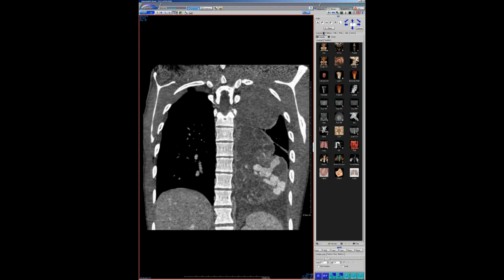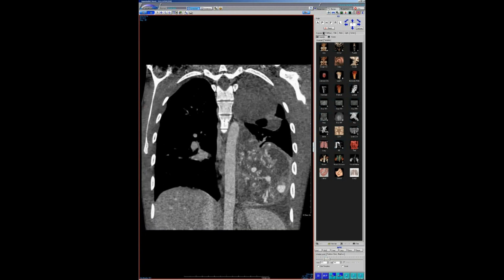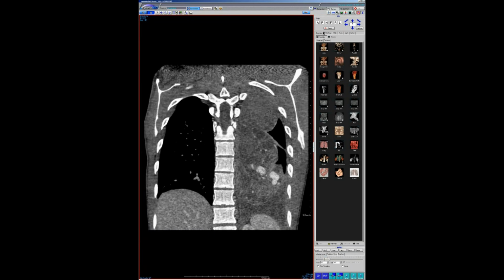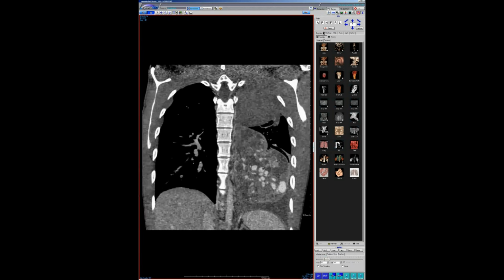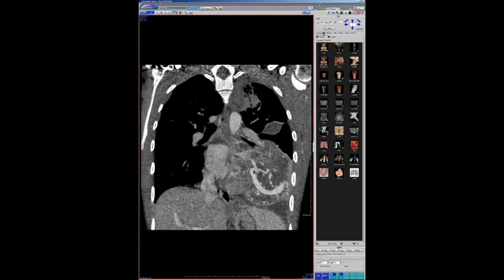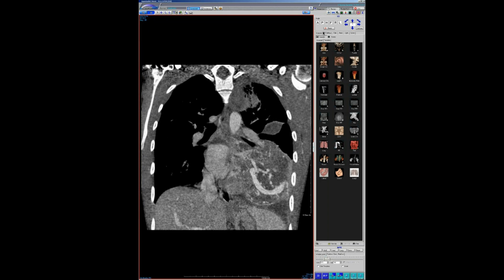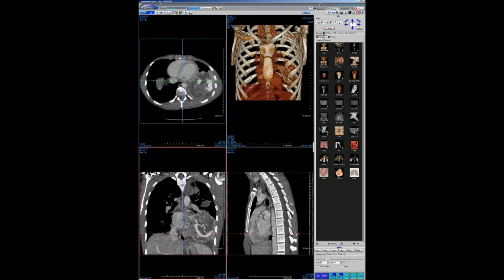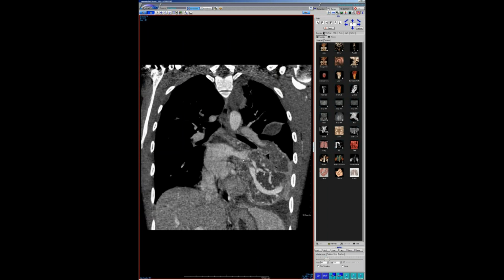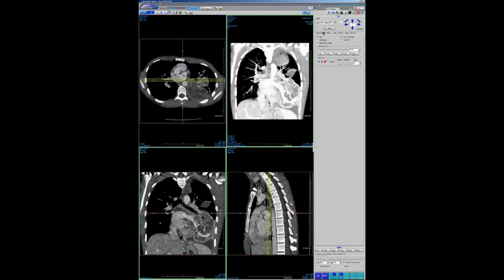Does it connect to a pulmonary vein? Yeah, the main thing. Some of these can just go into the mass and disappear in this tangle. Other portions, like this big portion here, come back in, and when I was following it back in, it reconnects to this pulmonary vein. Got it. So I think what's happening then is it's got a systemic arterial supply probably. And that's what's propelling so much blood flow that the vein is hugely distended like that.